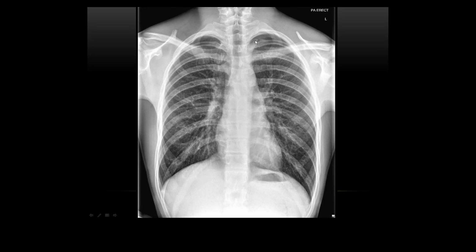It's a tricky one, this one, but pneumothorax. Very, very subtle pneumothorax. They're not going to treat it, but again, look towards the edges, see a pleural line, and then distal to that pleural line, there are no lung markings.